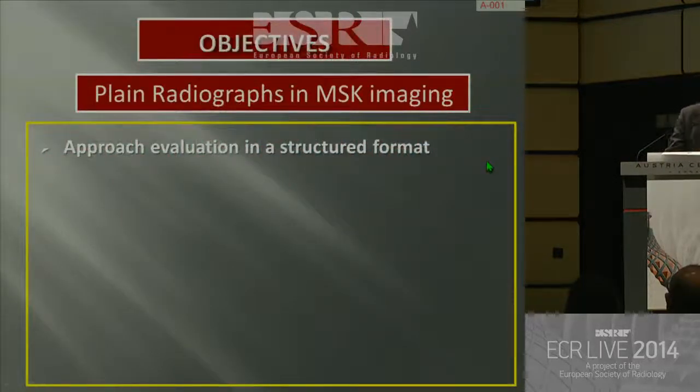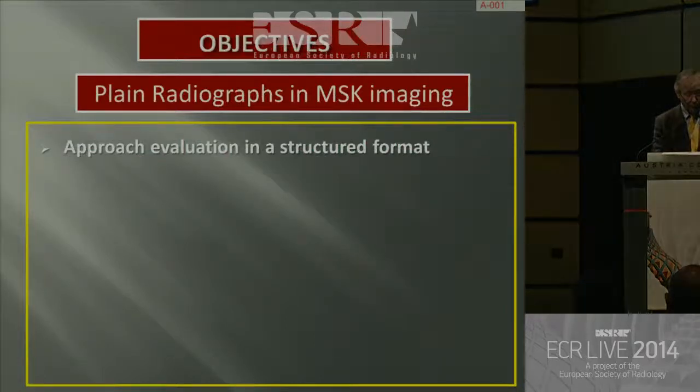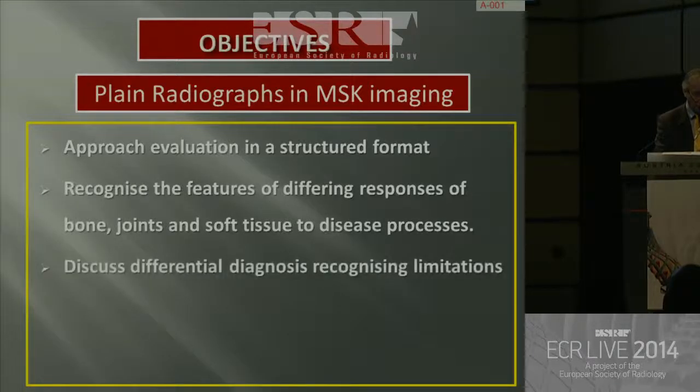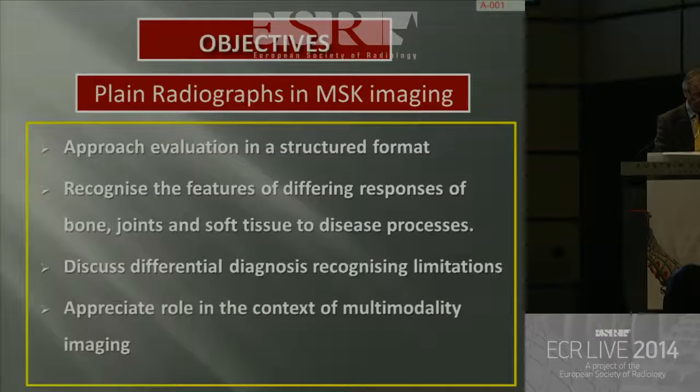Now, the objectives of this talk are to approach the evaluation of the plain film in a structured format. I hope to show you some of the differing responses of bone, joints and soft tissue to disease processes, discuss the differential diagnoses and recognize the limitations, and finally appreciate the role of plain radiography in the context of multimodality imaging.